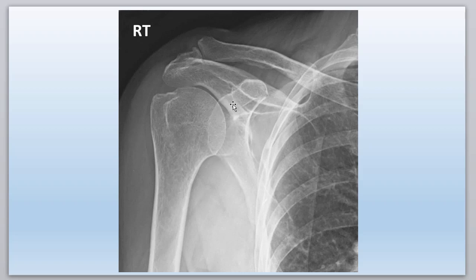There's actually a head of the scapula that gives rise to the glenoid cavity, and beneath that is the neck, a little thick part beneath the glenoid, and we can have fractures through the neck and through the head. The head is very thin, but the neck is a little bit more beefy.